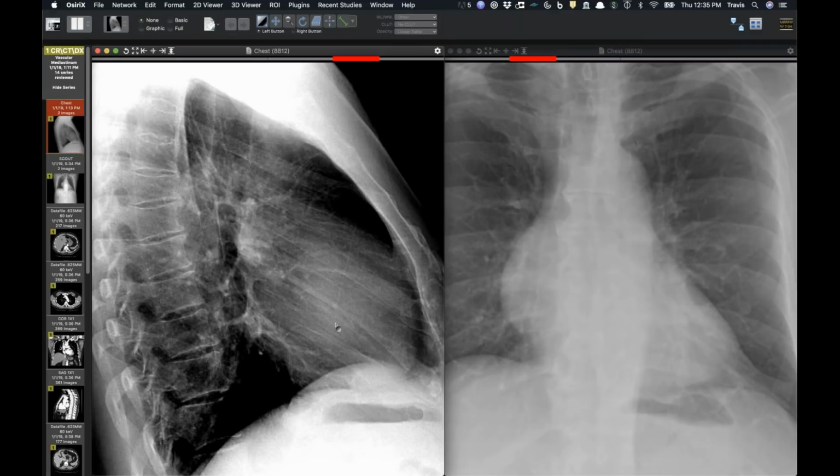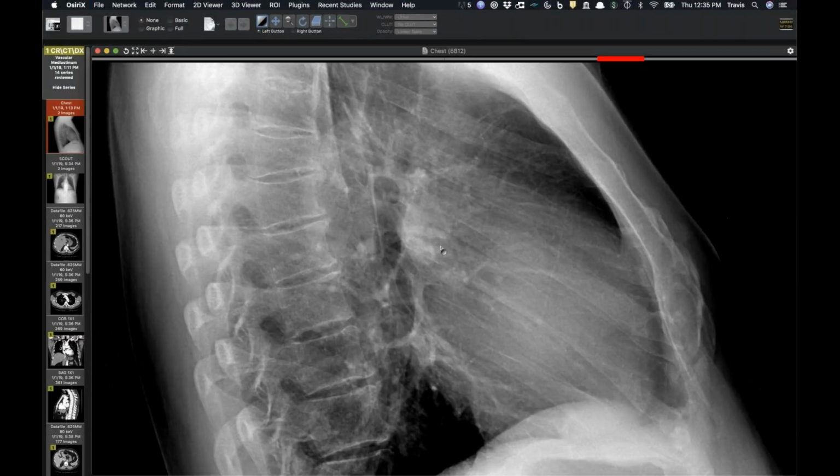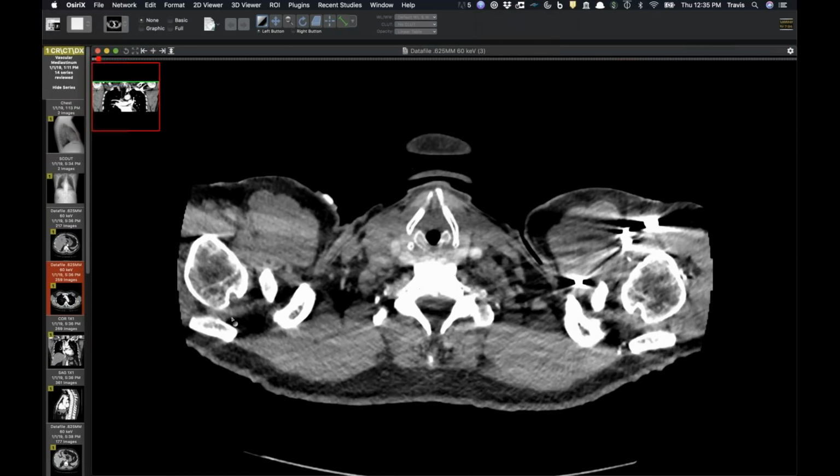And maybe you can say there's a little bit of increased opacity over the heart. I think just looking at the lateral, on its own, it's really impossible to say there's anything here. But you have this abnormal convexity here. And so going through this with my residents, it looks like it's in the anterior mediastinum. So go through typical lymphoma, thymic neoplasms. He was an older patient, less likely germ cell tumor. And turns out that it is none of those.